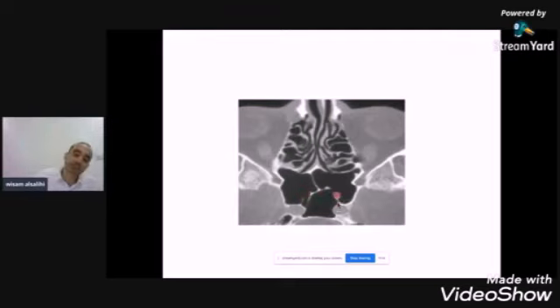There is a variation, retromaxillary pneumatization of the posterior ethmoidal air cell, described by Islam Herzallah, a well-known Egyptian scientist. He called it the Herzallah cell. The Herzallah cell, or retromaxillary pneumatization of the posterior ethmoidal cell, is the cell found more posterior, behind the maxillary sinus and anterior to the pterygopalatine fossa.